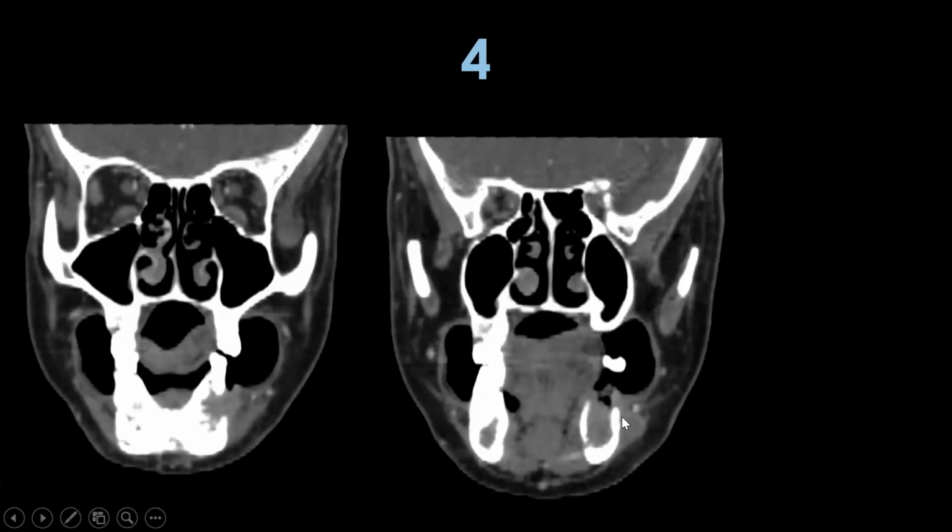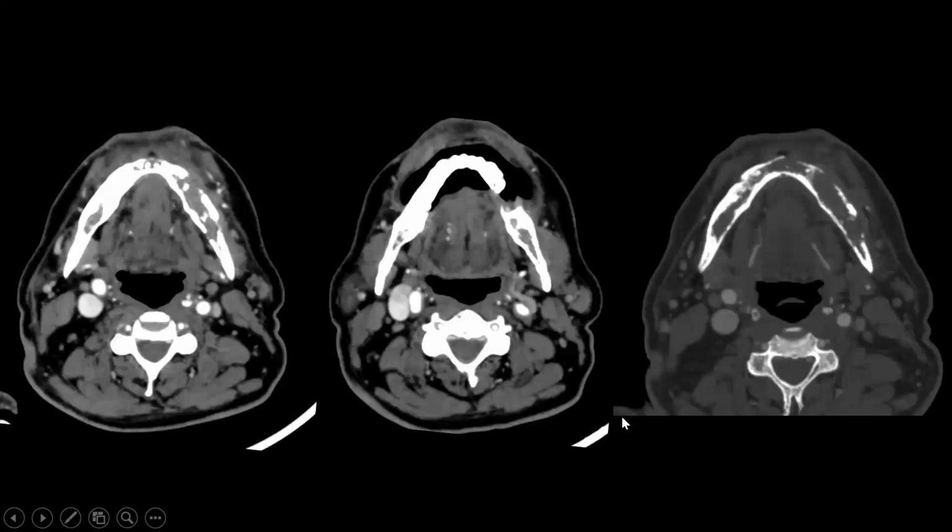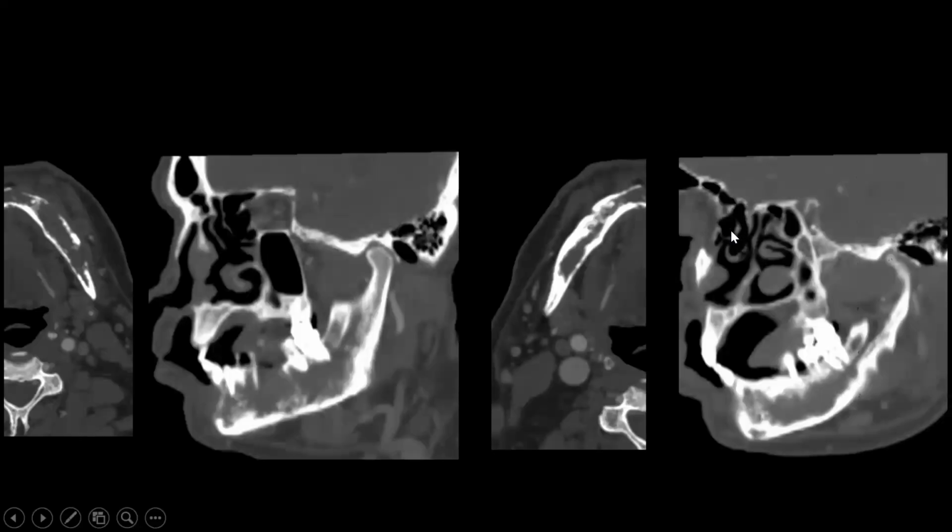There's thinning of the cortices on both sides. What I see on actual images, we can see this bony reconstruct. The lesion is crossing the midline and involving almost the entire mandible. So a lesion which was initially only seen on lower alveolus, when we did a CT imaging, we realized that was just the tip of the iceberg, and the true extent of the lesion is completely into the right side as well. So this patient will then need extensive mandibulectomy because of the extent of the lesion.